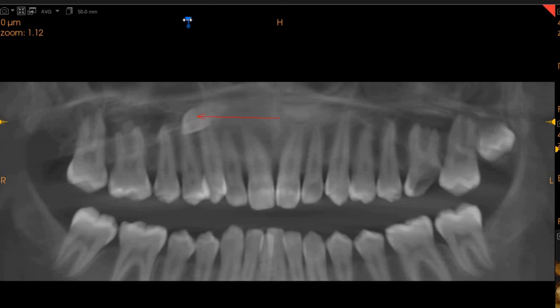Now this is the transaxial view. The tip of the tooth, the apex, is towards the first premolar. As you can very clearly see, we don't think this is an impacted canine. We do believe this is a supernumerary tooth because we got 1, 2, and 3. The canine looks perfectly fine in its shape and size, but we still, however, evaluate for our doctor.